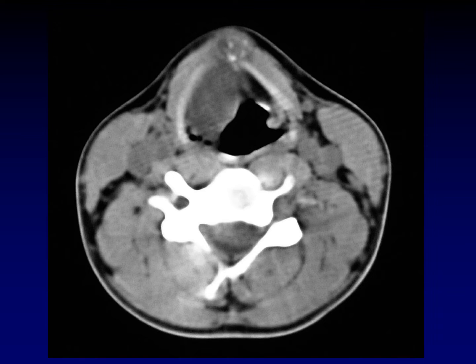Here's an example of a thyroglossal duct cyst that appeared within the larynx. This is not that uncommon. Remember how the thyroglossal duct gets wrapped up into the hyoid bone during fetal development. This means that you often get thyroglossal duct cysts that wrap around the hyoid bone and even end up intralaryngeal. So that's not unusual. But there's something else that's really important to observe in this particular case.